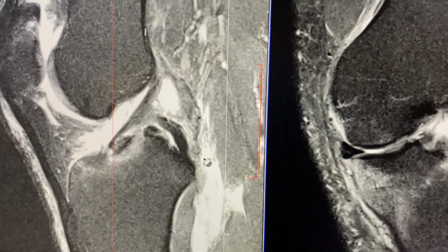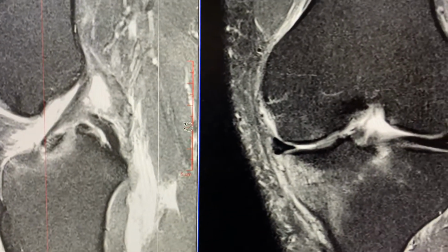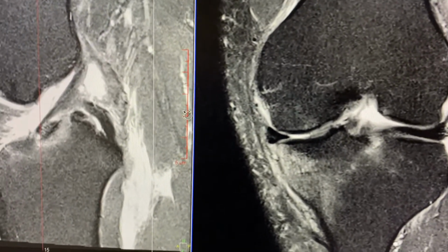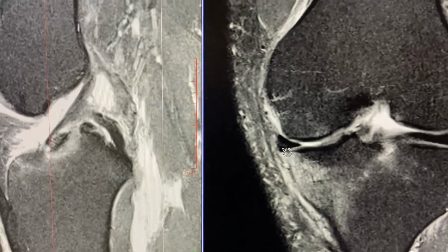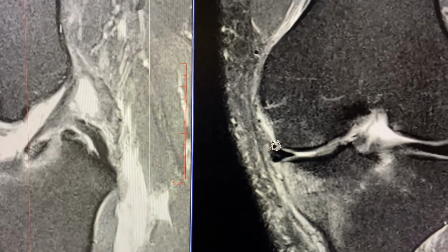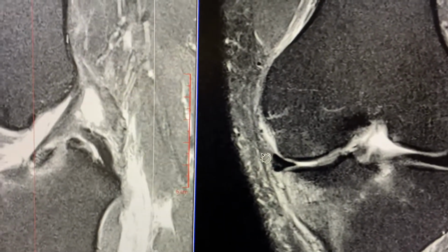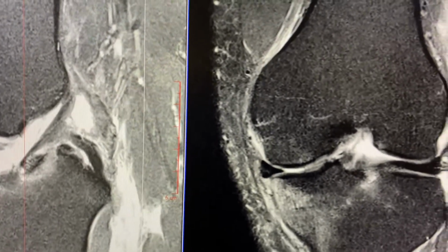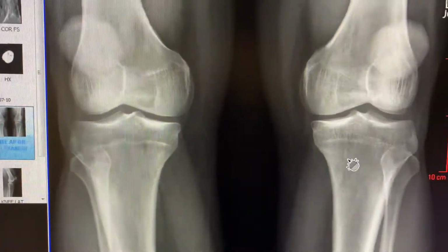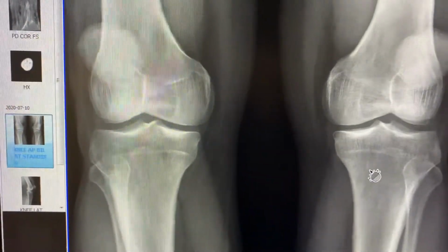If you see a approximately 50-year-old patient, maybe a little overweight sometimes, misstep, posterior knee pain, severe swelling, painful weight-bearing, suspect a root tear, especially when they say it hurts in the back of the knee. So number one, pain in the back of the knee. X-rays usually show a little bit of joint narrowing. So for example, this particular patient, 50-year-old male, slight medial joint space narrowing, not much at all.